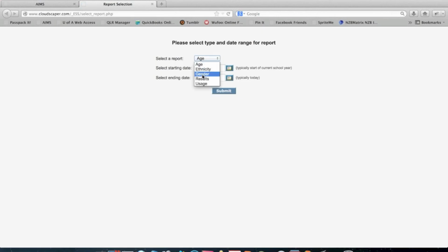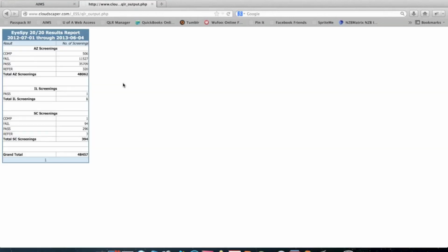And all of these reports, by the way, this is really just a sampling of the reports. It's not really the end-all be-all. These reports, I can create additional reports based on what users' needs are.